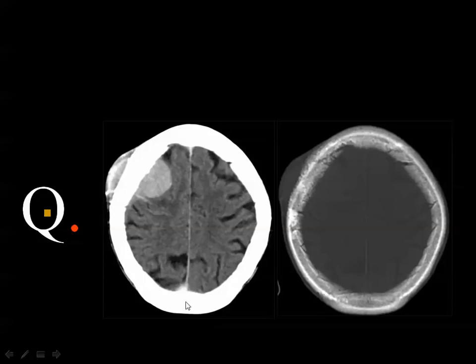Axial CT scan of the brain after contrast injection, soft tissue and bone window images. Hematoma, you mean hematoma? No, I forgot, you said hemangiopericytoma, which is considered aggressive. Hemangiopericytoma. Based on what? Hemangiopericytoma is a big lesion that destroys bone. Is associated with bone destruction. But here, the bone is not destroyed.